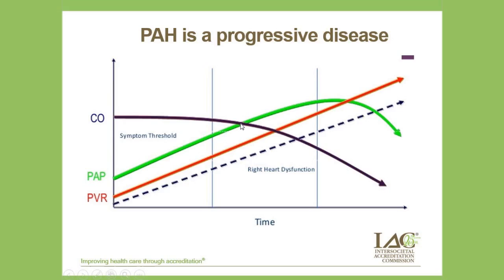The cardiac output is still intact, and yet the pulmonary artery pressure at this point would be similar compared to this point where the pointer is, but the difference is the cardiac output is now markedly reduced. So I think our patient's trajectory is actually on this far screen right, wherein her cardiac output was reduced.